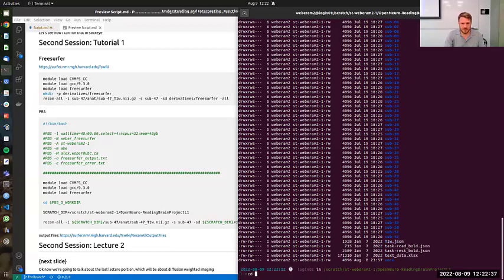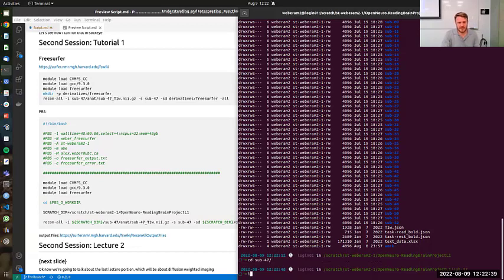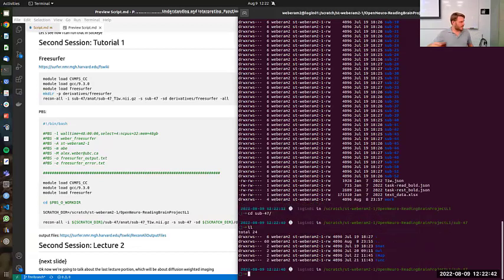So let's look inside one of those. I picked subject 47 here. If you ran your tester script that you had before on this, it should pass, if they did it correctly, but I don't know if there's any guarantee that that's the case. That's a good point. Yeah, it should be. I think if you're going to upload to an online repository, that would be the nice thing to do. I found for this one there were a couple of steps I needed to do, so I'm going to show you.